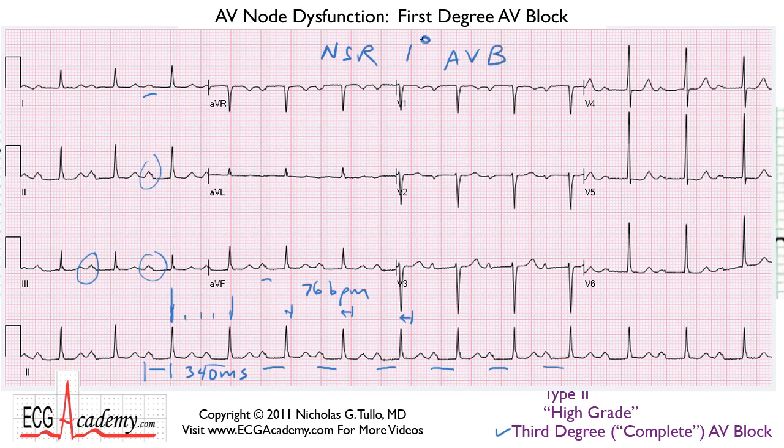That little degree sign, like the number of degrees in the temperature, is how we sometimes abbreviate it. Some people will write out the words first degree, however you prefer. Let's look at a couple of other examples.